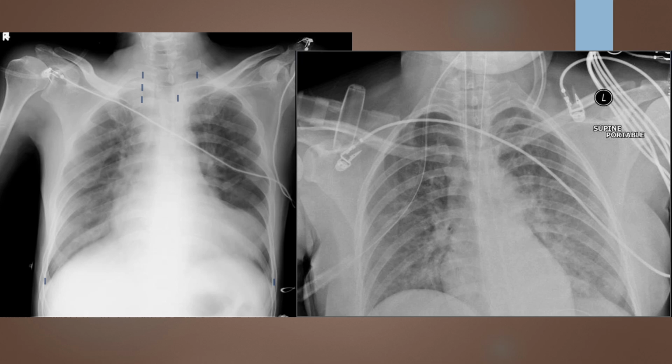For this image, mid-sagittal plane rotation follows with our SC relationship to the spinal column, so we've already evaluated that. When I look at mid-sagittal tilting, I'm going to be looking at the long axis here.